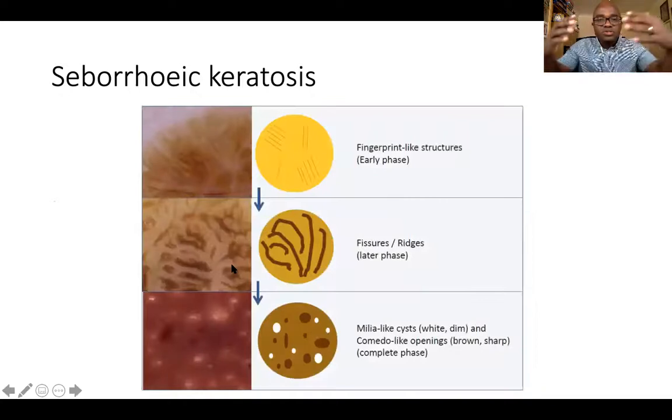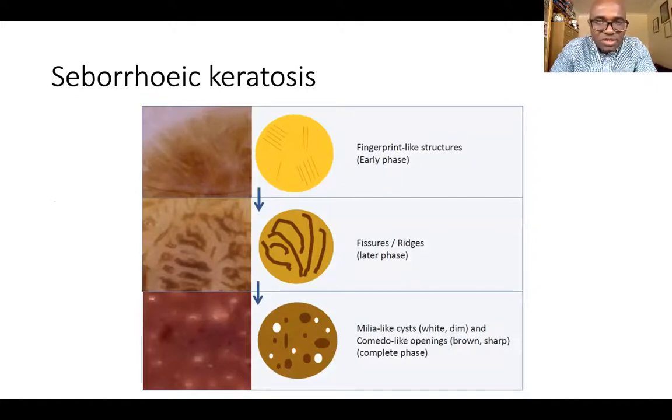So it's really important to understand seborrheic keratosis. The majority of two-week-wait referrals to dermatology will be seborrheic keratosis, and most doctors will describe it as a mole because the patient thinks it's a mole. Your expertise as a GP, after doing some dermoscopy training, is in recognising that this hasn't got any features of a melanocytic lesion, as I talked about, but it has all the features I can see of a seborrheic keratosis.